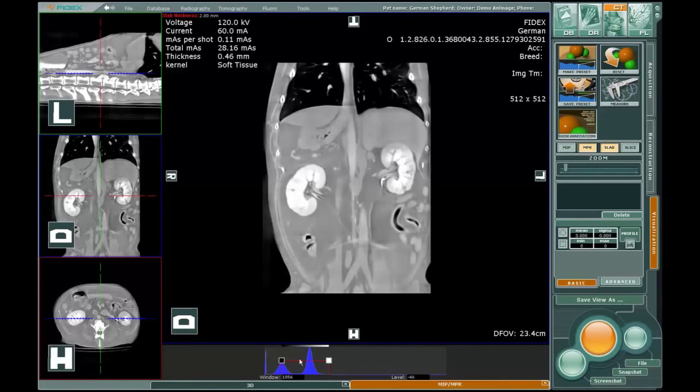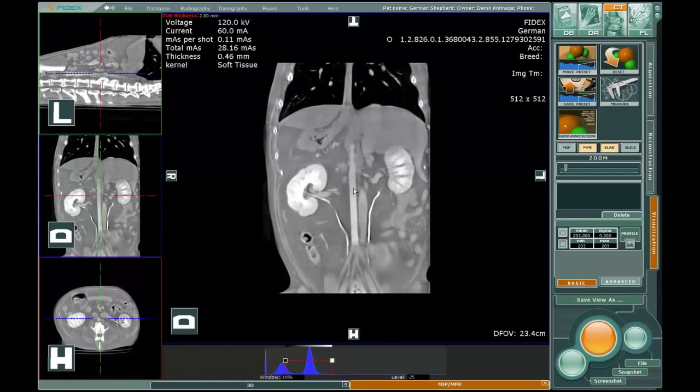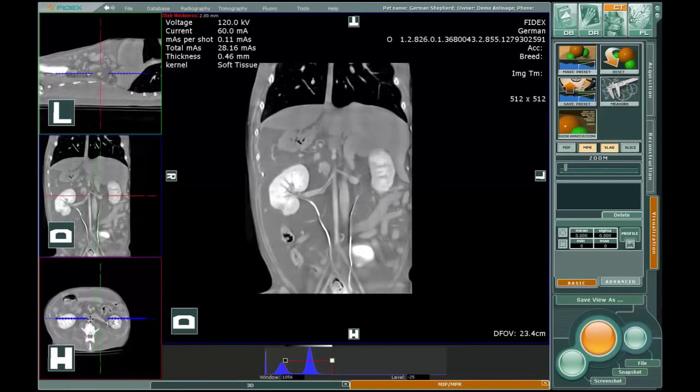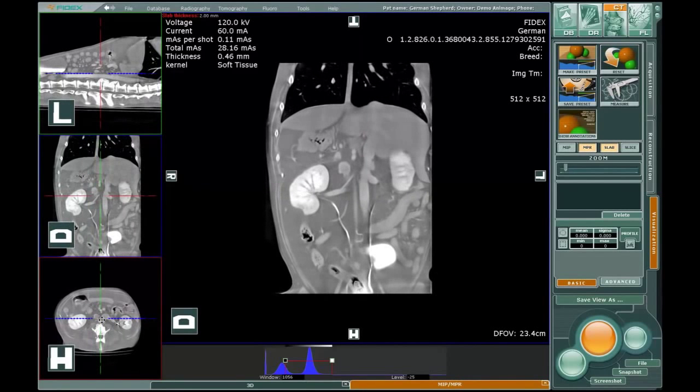You can scroll through the slices using the mouse wheel. You can also grab the image in the axial, sagittal, or coronal cuts by placing the cursor into the crosshair center of the small window. Use left mouse button and drag left or right. You will see that the 3 images are coupled in 3D space. The sagittal or axial view can be brought into the main window by double-clicking.